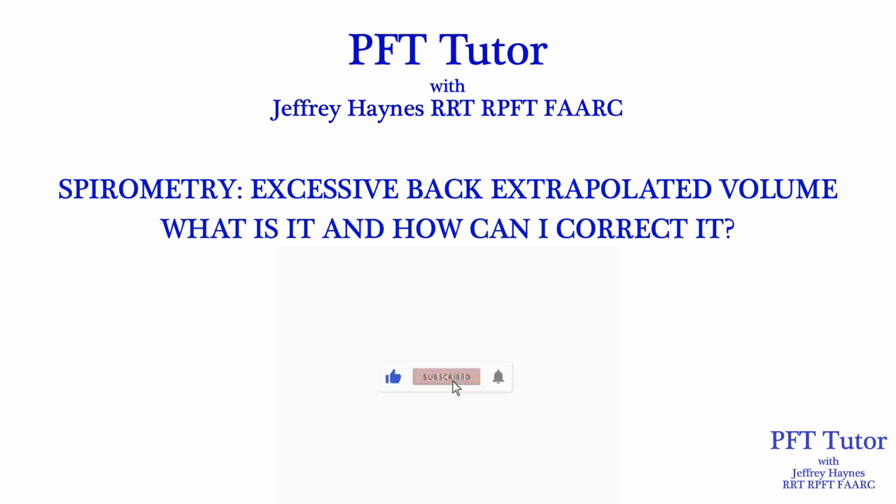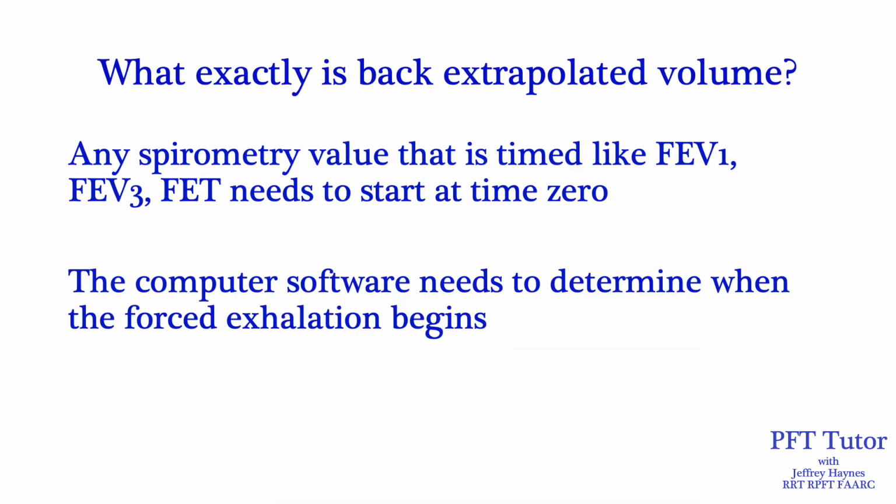It's greatly appreciated. In this video, we're going to discuss a common error encountered during spirometry testing, excessive back extrapolated volume. We'll discuss what it is and what you can do to correct it. So what exactly is back extrapolated volume?